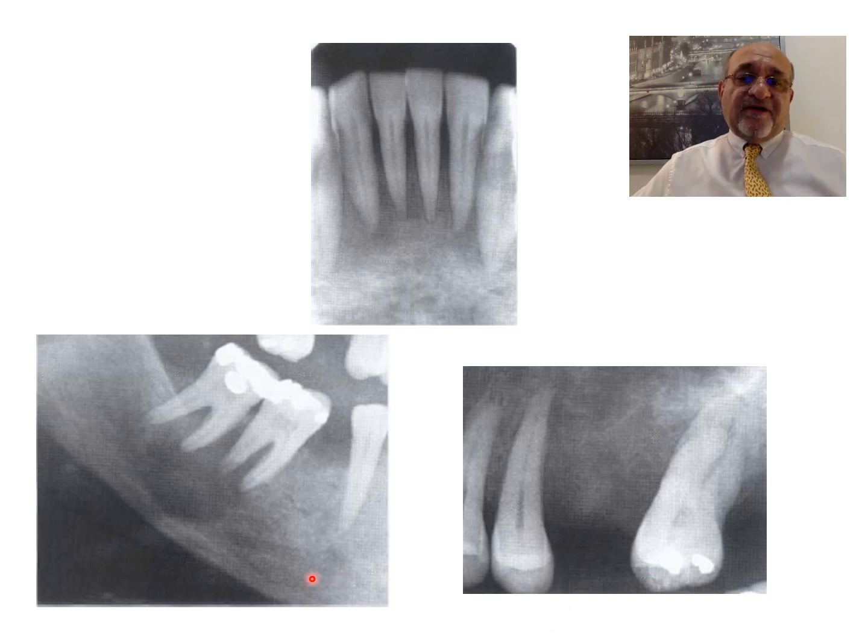Another case over here with a brown tumor lesion. First, generalized absence of lamina dura. Second, the teeth, especially those two molars, don't appear to be attached to the bone in this area, which we call floating teeth. And have a look at the inferior border of the mandible in this area, how thin it is. There is also a change in the trabecular pattern of the bone.